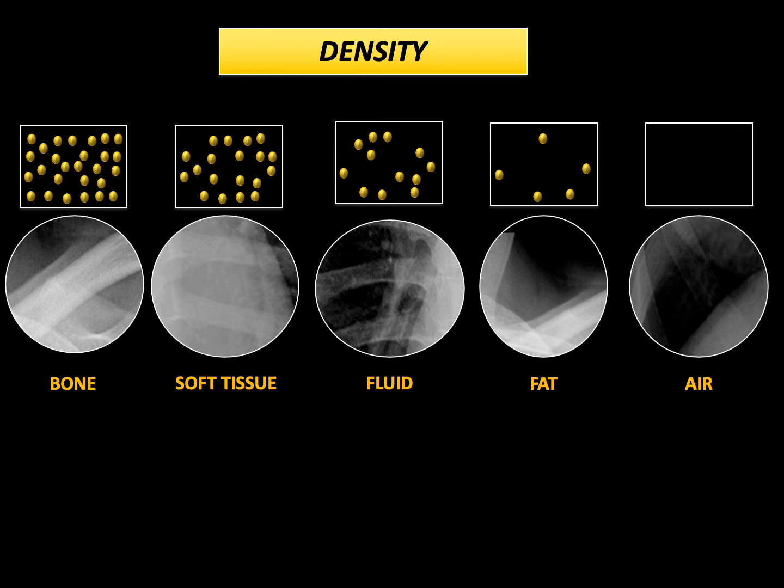Hence, the lung fields that we see appear black, whereas the mediastinum, the heart, the liver, and the chest wall all have varying degrees of soft tissue density because they attenuate the X-rays which pass through the body. Okay, so basically what we're looking at is a soft tissue in the background of black tissue. Or we're looking for soft tissue pathology against the dark lung parenchyma.